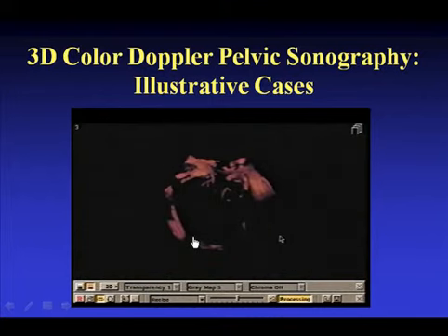And this is the vascular cast image of these abnormal vessels.